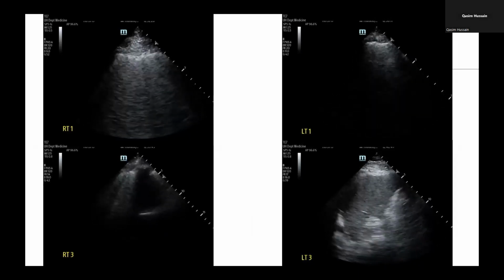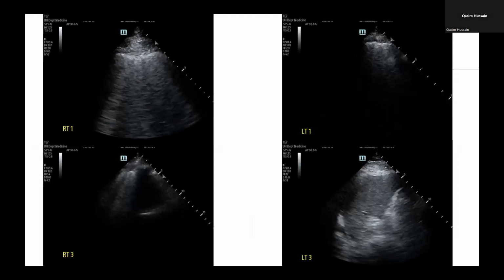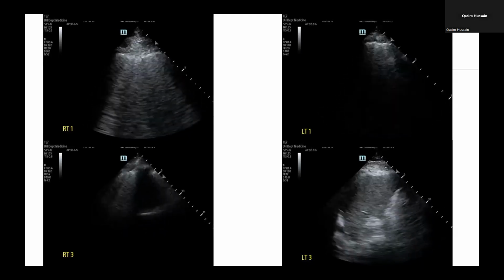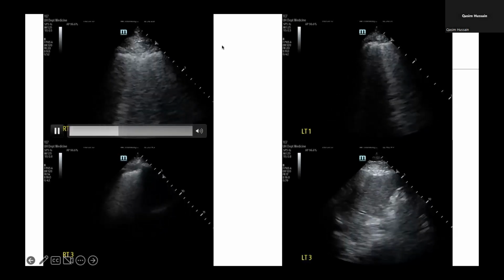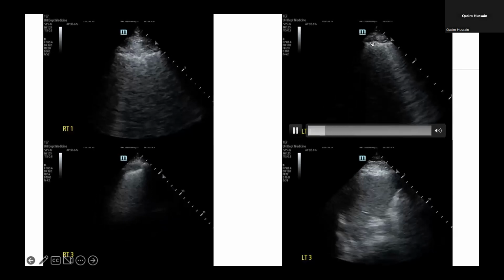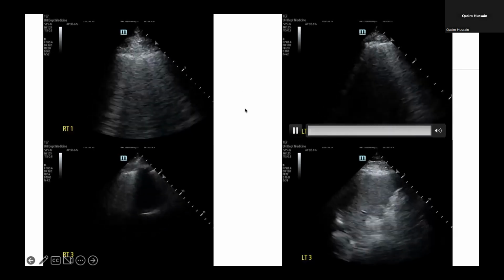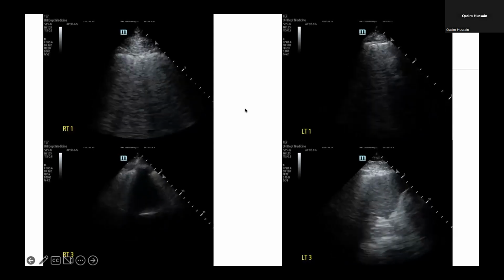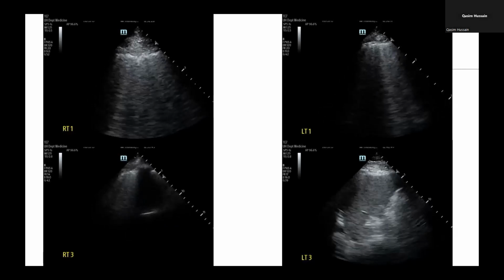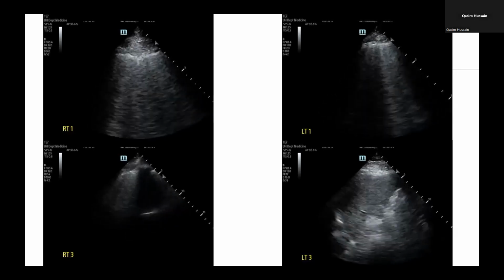Again, B-lines are also non-specific because they're just showing essentially pathology or some sort of irregularity in the pleural interface. And if you actually take a closer look at the pleura, it might be a little bit thickened here, and over here, maybe a little bit jagged, maybe a subpleural consolidation coming in. But the thing is, in our interstitial lung disease patients, who knows whether this is acute or chronic, unless there's some sort of significant change from previous, and they have previous scans or previous x-rays.